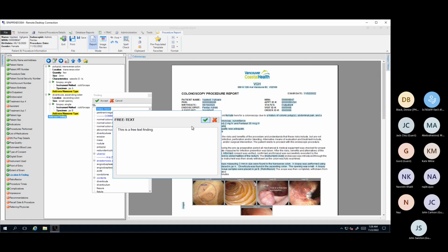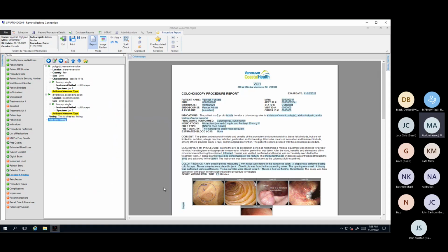Okay, accept that. You'll notice now it's inputted all of that data for us.